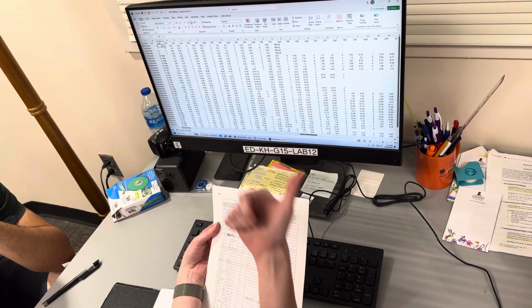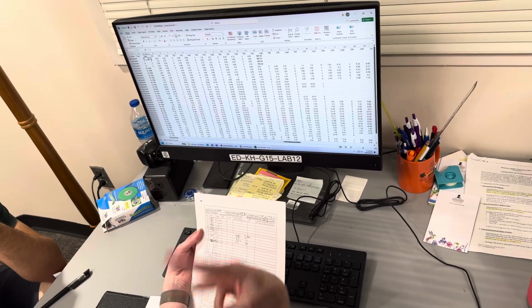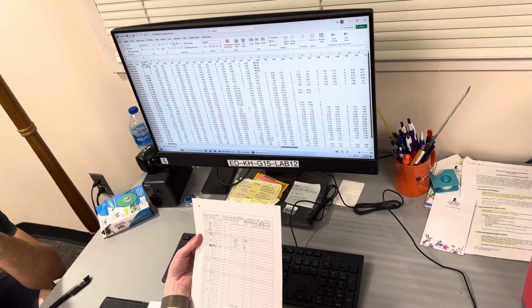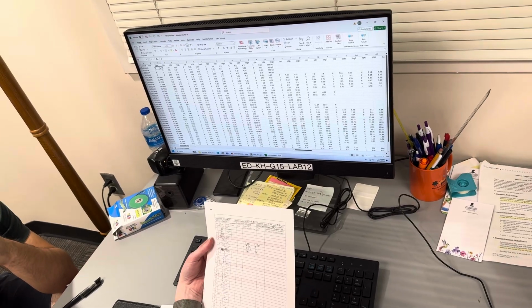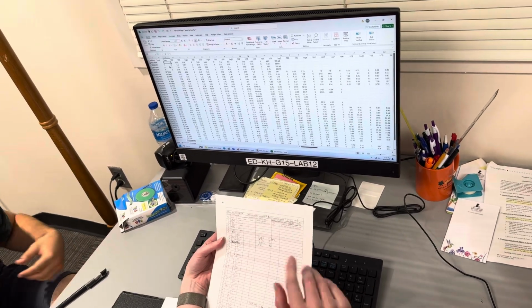So slow walking, you would type a number 1. Normal walking would be a 2, and then fast is 3. So that's why the type has 3 there. So these are our 2 fast walking trials. These are our 2 normal walking trials. There's no slow in this one.